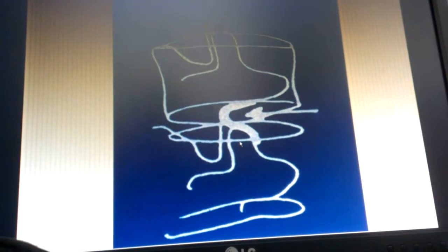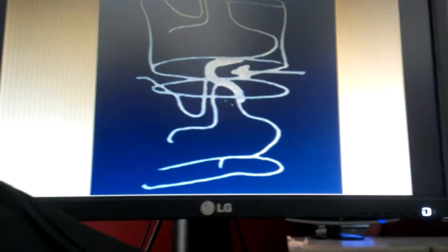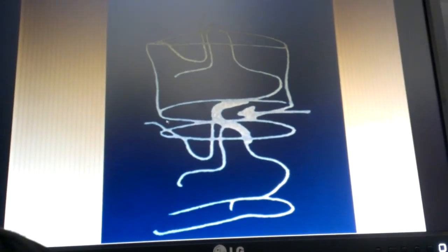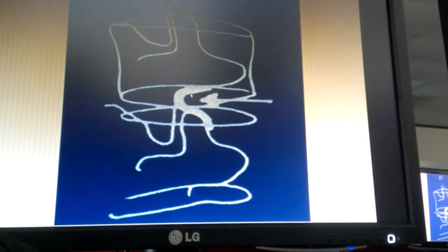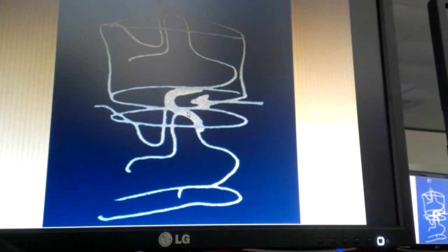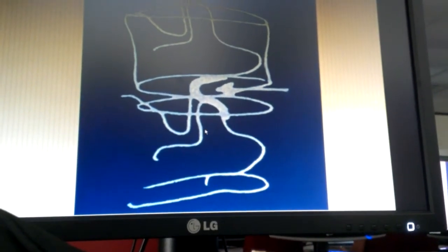And that discontinuity could also be, it's not just necessarily gapping or space, it could be that there's, say, a decrease in disc height, this disc might be compromised, and so the superior articular process could be jabbing into the neck of your Scotty dog or the vertebra above, right? And there could be hypertrophic changes coming off of this. So those are the kinds of things.